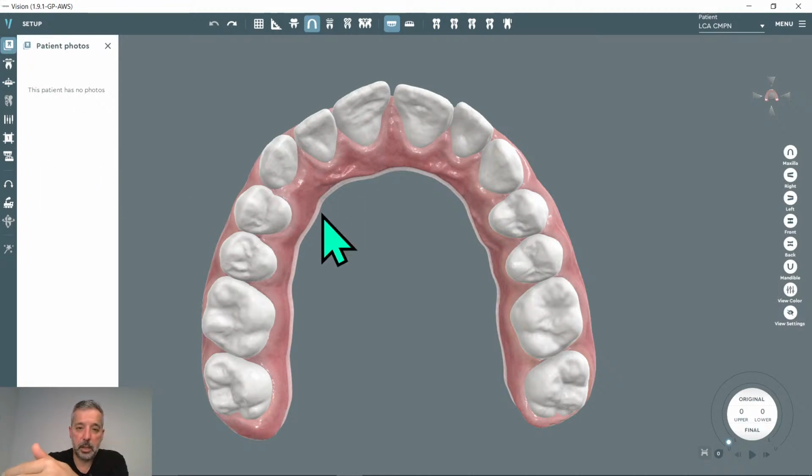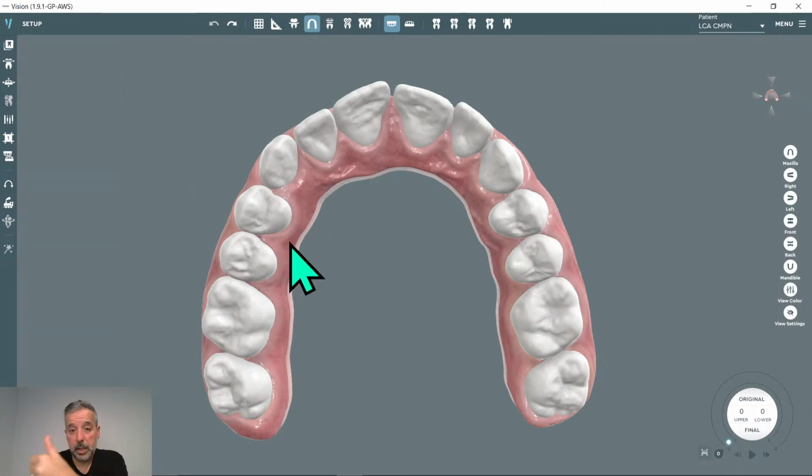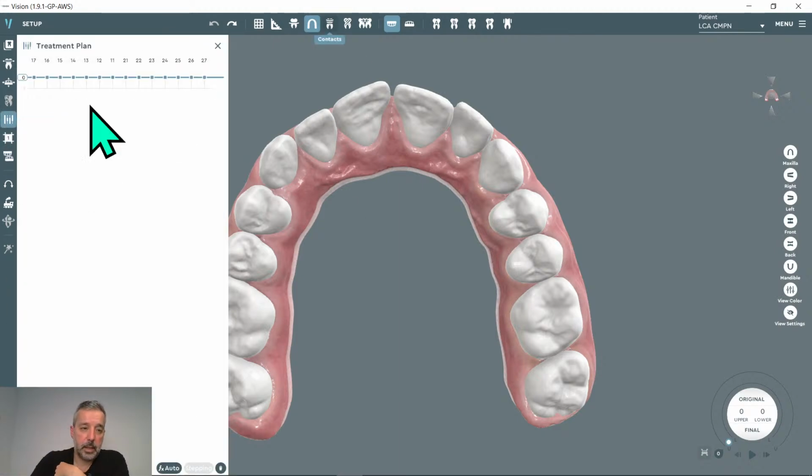When you register the case, it is possible to import pictures, and obviously CBCT and X-ray, and manage the model analysis like Bolton and analysis of the space, and also jaw displacement to adjust the jaw, and sculpt tools for some artifacts.